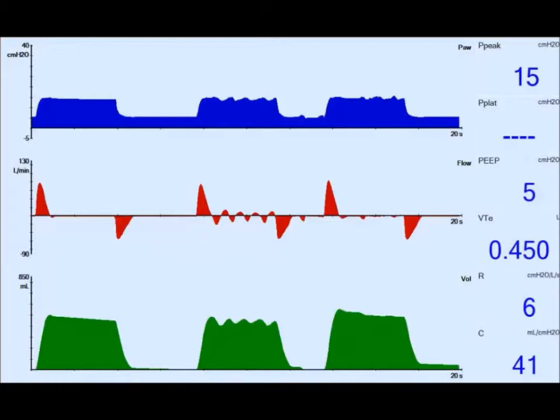Here's an example of airway pressure release ventilation. You can see someone actually breathing on top of the inspiratory phase. Now the exhalation valve, based on the pressure control setting, acts as a kind of PMax. So this is probably why it's fallen out of favor. However, accounts that use volume control ventilation as a primary mode all the time still use PMax.